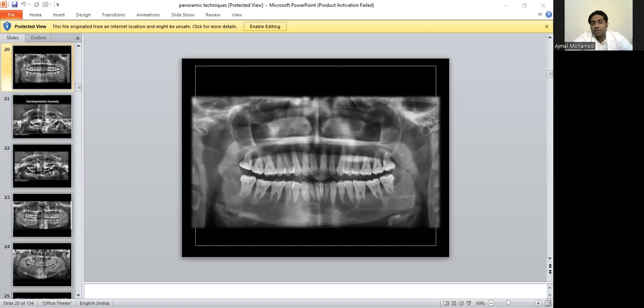Now, the patient came to us with a large swelling on the left mandible, and you can find a very large unilocular to multilocular radiolucency, and there is an impacted molar, and the lesion is encircling this impacted molar. The diagnosis of this case came as keratocystic odontogenic tumor, previously called OKC or odontogenic keratocyst. Surgical excision of the lesion was done in this case.